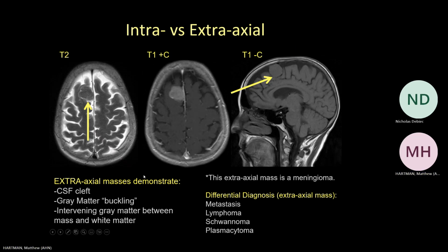So this is an MRI. The bones are dark. We have T1 with contrast. So that's a good pearl. Anytime you have with contrast, it's always a T1. And you see the falx lighting up, some of the vessels. This is T2. Our CSF is going to be bright.